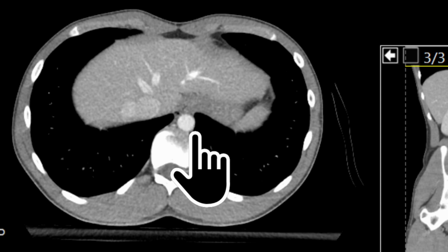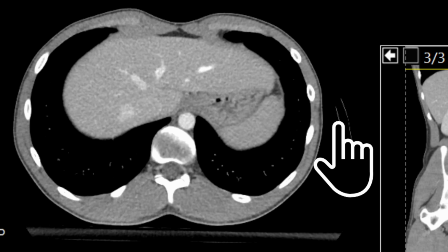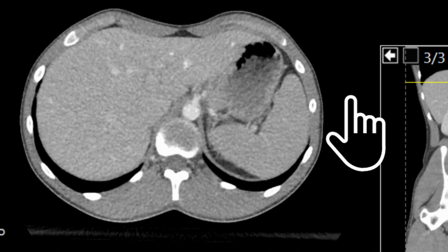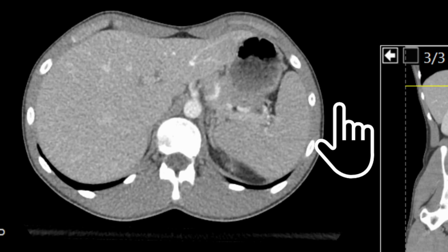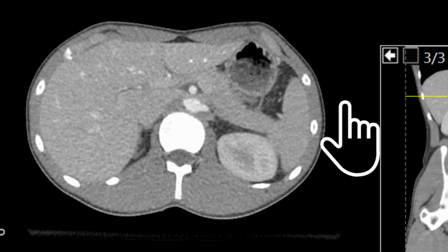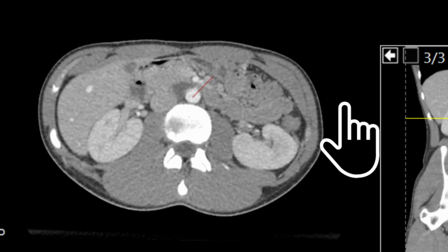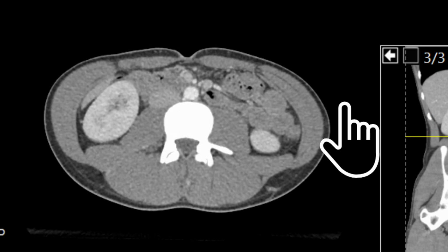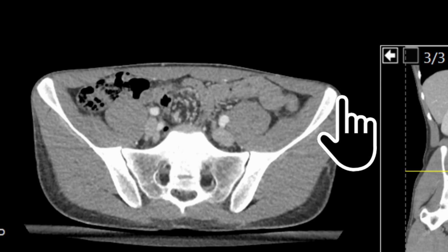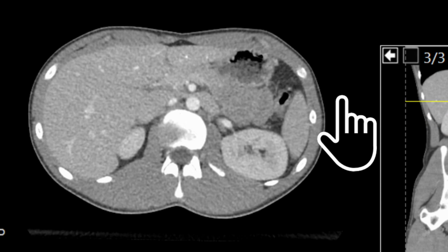So you've got to remember that this is a large blood vessel. If you cut a section through it, it looks like a circle. So let's follow that circle down as we scroll down. We're into the abdomen. We can see the diaphragm there. You can kind of get an idea there of the aorta passing through that gap at the back of the diaphragm. Oh, did you see what happened there? And then as we keep going, something else happened there, and then, ooh, it's changed again. So we have a number of changes. I'm scrolling up now. We have a number of changes going on.